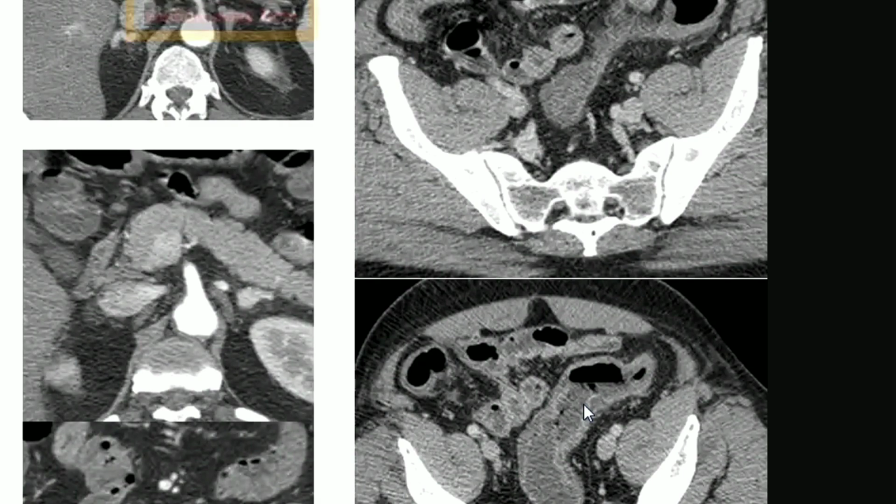I want to comment about the protocol of bowel ischemia. It's very important to do pre-contrast images to exclude any hemorrhage in the wall of the bowel. Then we do an early arterial phase or angio to evaluate the patency of the arterial system, then a portovenous phase to exclude any venous thrombosis, and avoid giving positive contrast or gastrografin. We have to give only water or negative contrast. So this is a case of ischemia secondary to thrombosis of the inferior mesenteric artery.